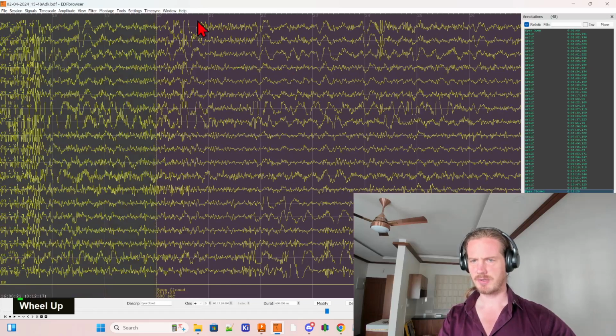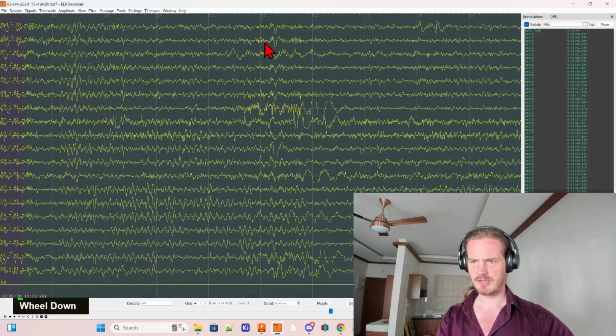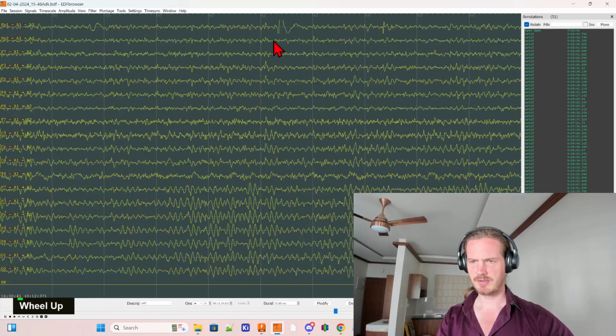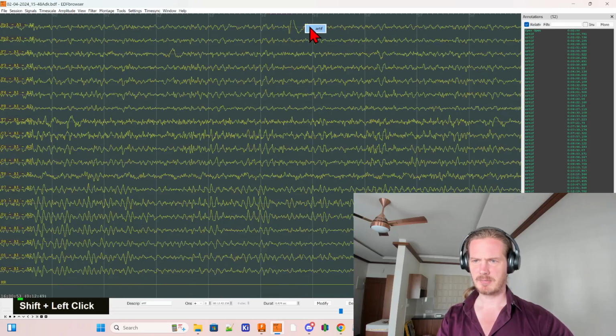And we can see a lot of motion here, so I'm just going to mark this whole period over here as artifact. And then it starts, and then we have some artifact over here, and up. And we have something over here. And now, with the eyes closed, they're sitting nice and still. And this over here is just an electrode shifting for whatever reason, but I'm going to mark it. And here's the same thing. This is not an eye blink.